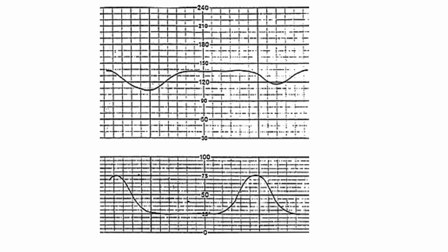This slide is showing a late deceleration with loss of variability. This is an ominous pattern, and immediate delivery is indicated. So as you can see here, the fetal heart is almost a flat line, and this should not be a flat line. There should be a lot of variation in this line, which is indicating good variability. And again, here you have the uterine contraction, the height of the uterine contraction, and the fetal heart rate starts to drop here, and it troughs or gets to its lowest point at the end of the uterine contraction and takes some time before it can recover. Similarly, this is also a late deceleration.